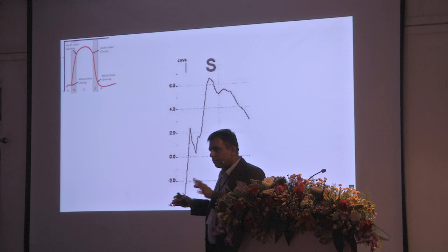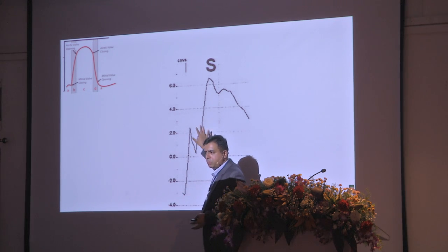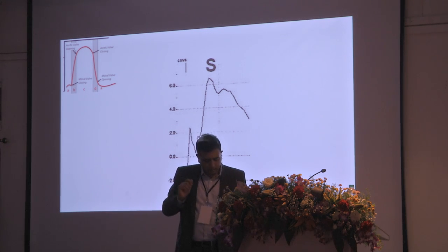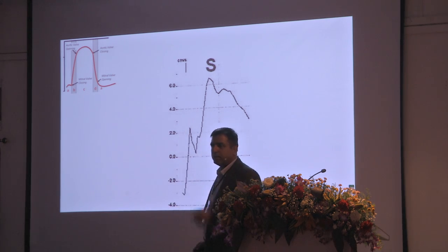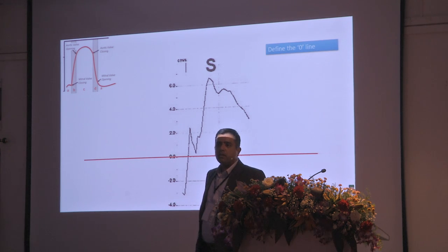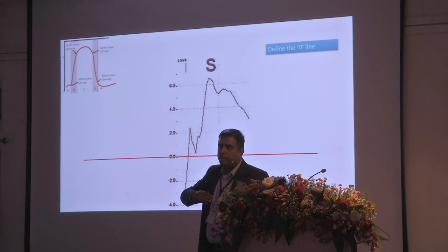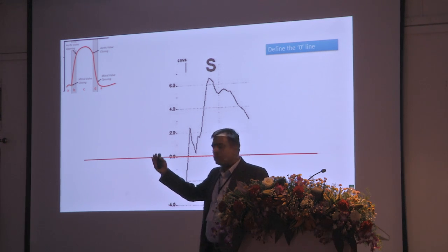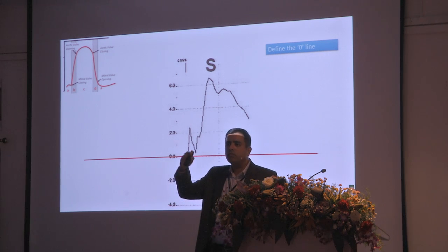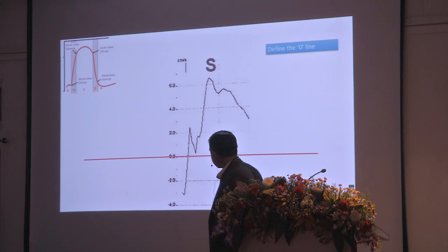I, for instance, want to tell you in this graph which represents which, so that you have a clearer understanding of the events that are taking place. So the first thing you need to do is identify where is your zero. Your baseline is very important, where the negative velocities cross over to the positive. If you have this reference in mind, it makes it easy for you to interpret all these different squiggles that you will find on the screen.